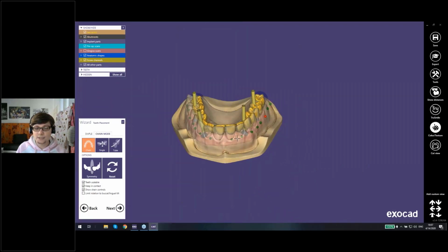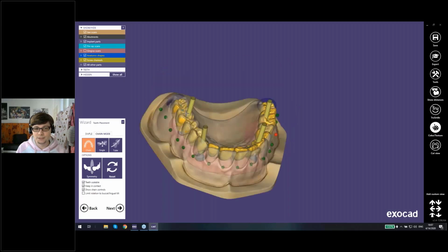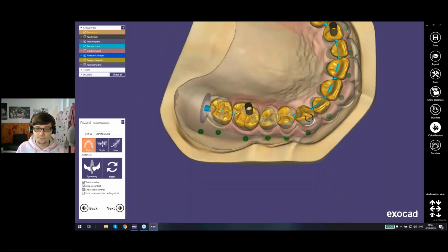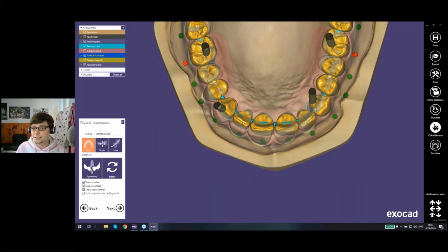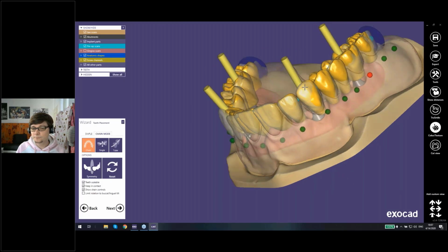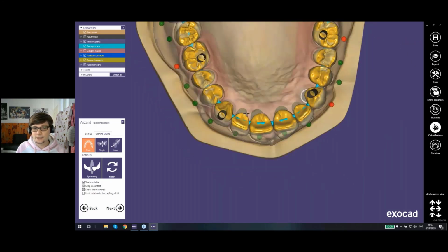And once you do this, you will see that when I now move the other molar, the first molar stays in position, but all of the other teeth, the complete row here, move in this chain mode. You see all of them move together and change their size and shape in the same way. So I can lock the second molar as well. And now I'm going to place the canines. First, this one over here. I'll lock it. And now the last one.